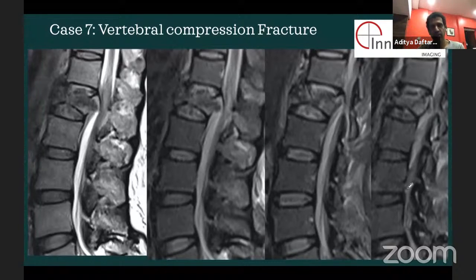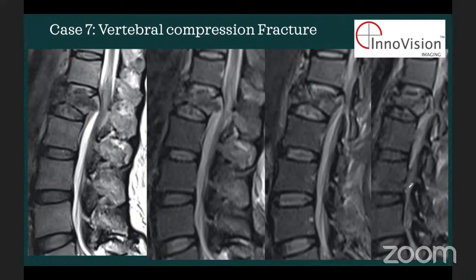Okay. And your decision in your head is, on the scan, tell me, is it something that I need to operate for, or is it something that I can just reassure the patient that, look, this is just post-operative change. It's going to take a little while. It's going to go away. Perfect. Thanks.